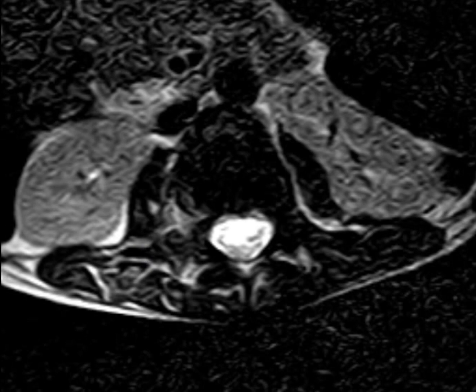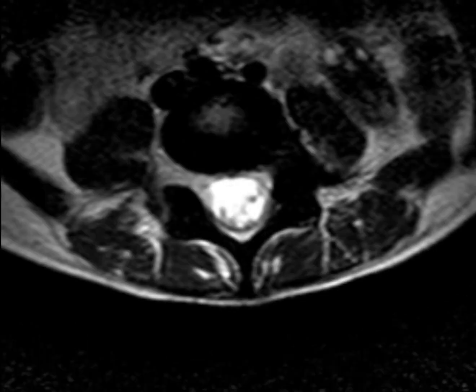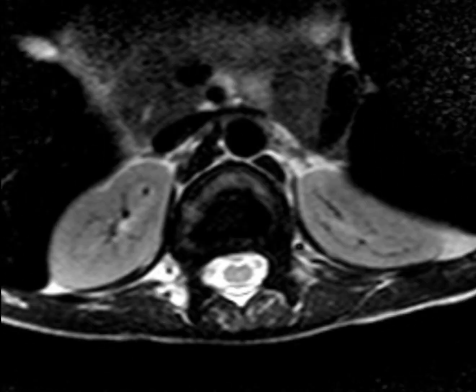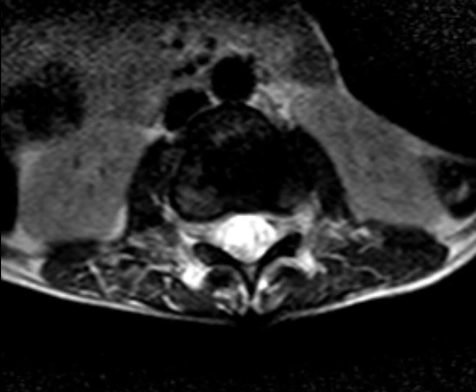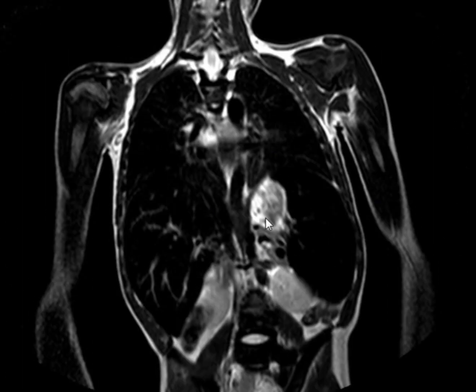Do we have the rest of the spine? This is a little bit better, maybe. Then, can you tell me if there's anything significant in the axial images? Or yes, let's go to the coronal. There is evidence of hepatosplenomegaly.